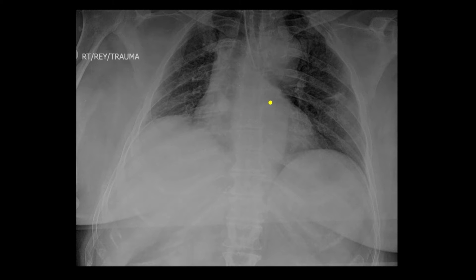In this patient again, they've told you that the patient has had major trauma, and again we're looking at the endotracheal tube, and this time you can actually see that the tube is directed into the left mainstem bronchus, and again this is not an ideal position, and the tube should be repositioned as quickly as possible. And the carina on this film, if we were to look for it, is about here, so you can see that this is probably 1 to 2 centimetres distal to the carina.